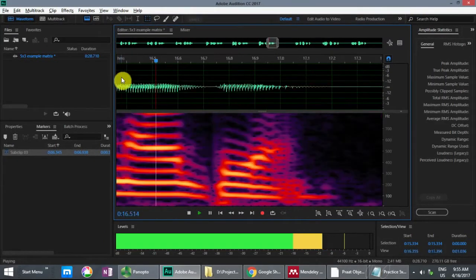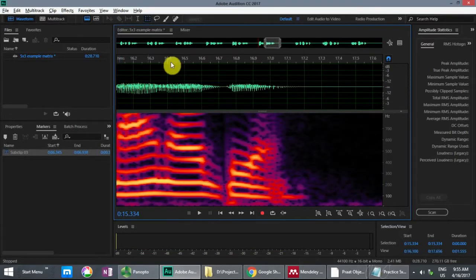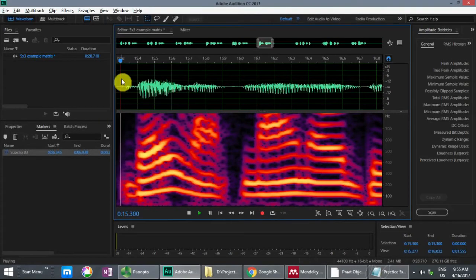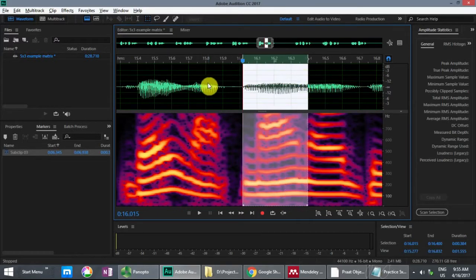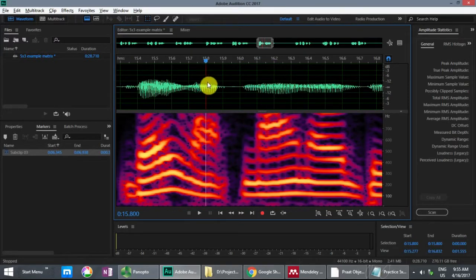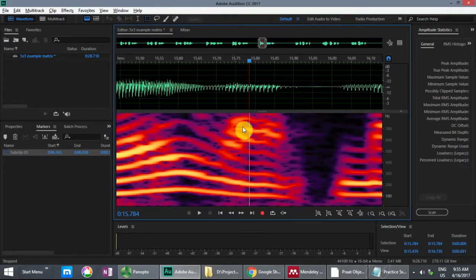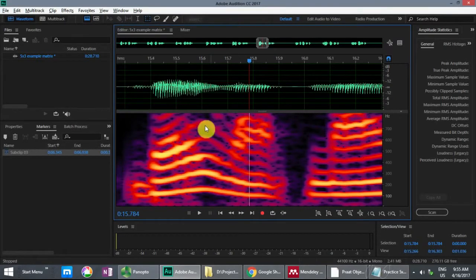Barry wants 9 old. Okay, let me zoom out just a little bit. Move back. Barry wants 9. So here's the wants, and here's the 9, and I need from wants to 9. So remember, I was just looking at this same word in a different sentence, wants. And so this spectrogram display should look familiar, and it does.